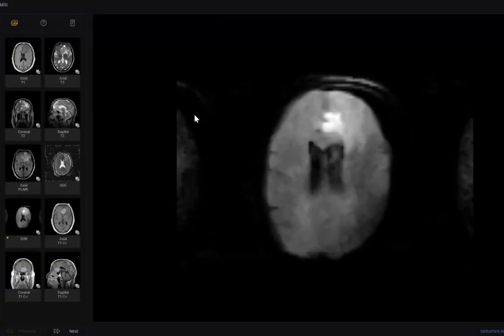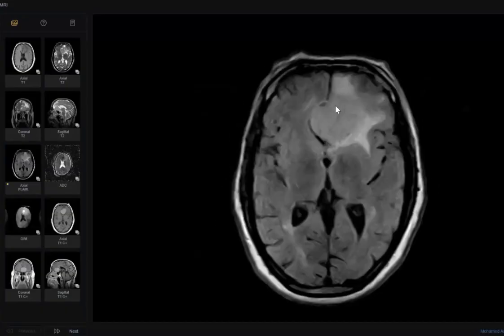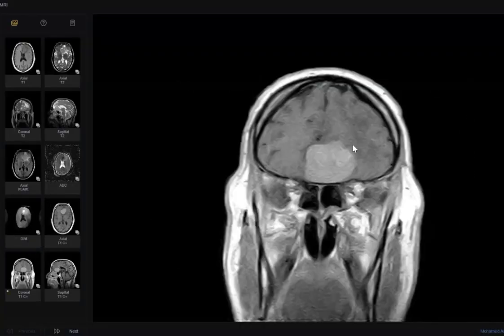Again, it was a case of meningioma. But the patient will not die from meningioma. The most important finding is the infarction. Why did this happen? Because this meningioma is midline parafalcine and it compresses the left-sided ACA.